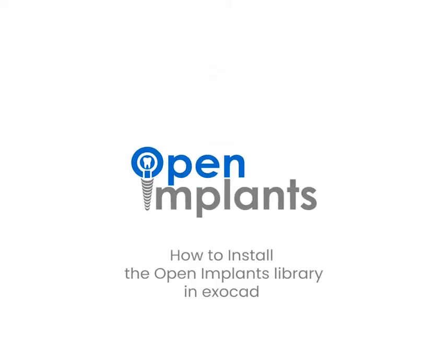Hi everyone, I'm Carrie Coakley and I'm going to show you how to install the exocad Open Implants library.